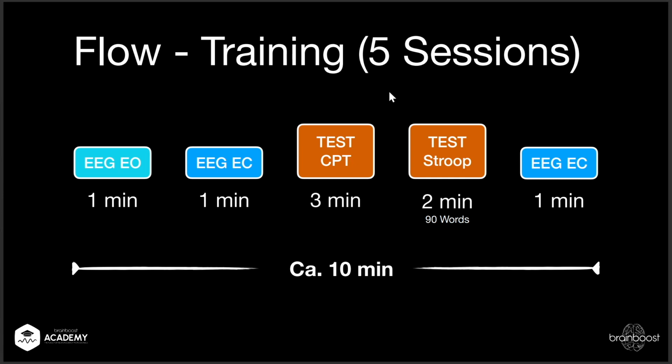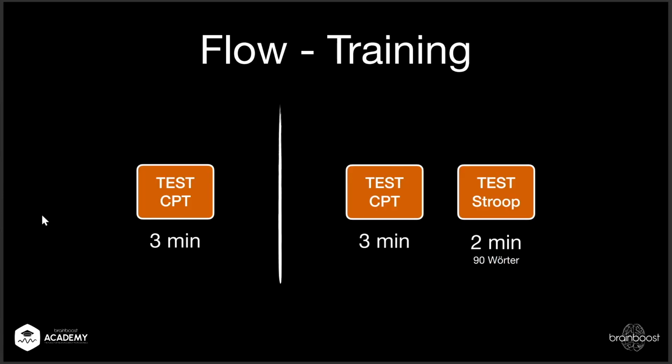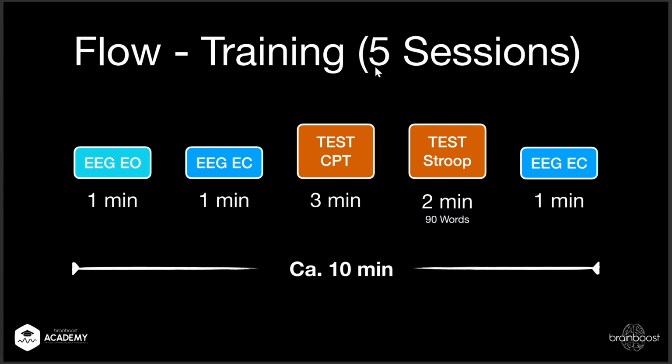Use different flows. A flow before every training or every second training. Use a flow every 5th session. I do approximately 10 minutes, as I said. This is not 10 minutes, but up front you need a little bit more, so plan with 10 minutes. So I have a small first consultation flow, so you don't take over the entire session by doing a flow.